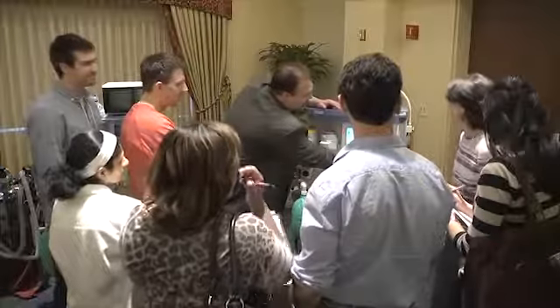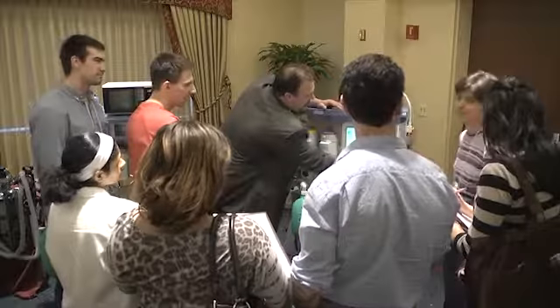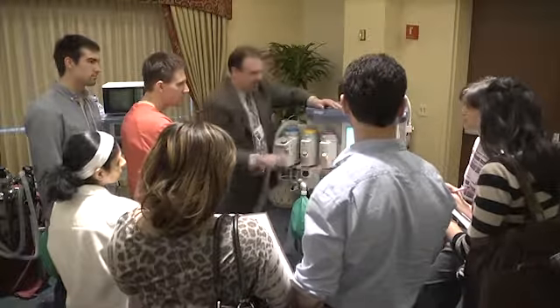Well, if you're about to leave the room and the patient is extubating and breathing fine, you could care less about the apnea pressure alarm. But in any other conditions, it's a very important one.